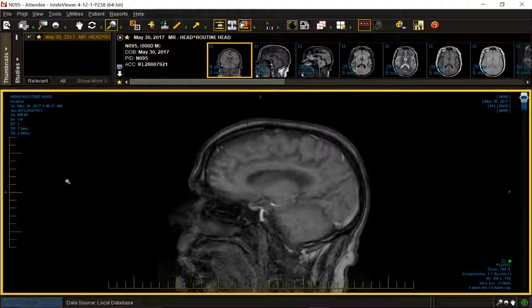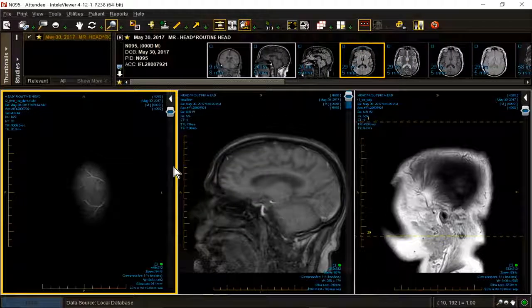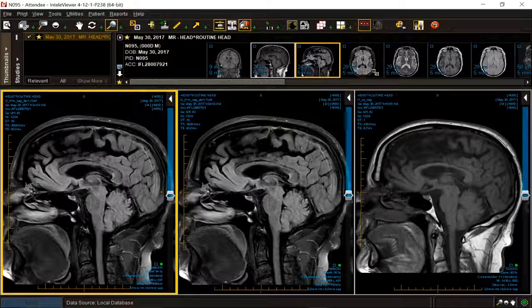A 74-year-old man presents with memory loss and balance disturbance. I'm going to start taking a different tack. I'm going to try not to put up the key images so that you are forced to search on your own. We're getting more comfortable with each other.